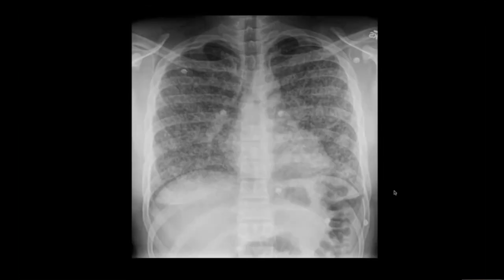This chest radiograph is showing numerous tiny discrete nodules diffusely distributed in lung fields. This is miliary nodules. Differential includes miliary tuberculosis, particularly where tuberculosis is endemic in that region, so there's a top differential. Other differentials include fungal infections or miliary metastases, particularly thyroid carcinoma or renal cell carcinoma.